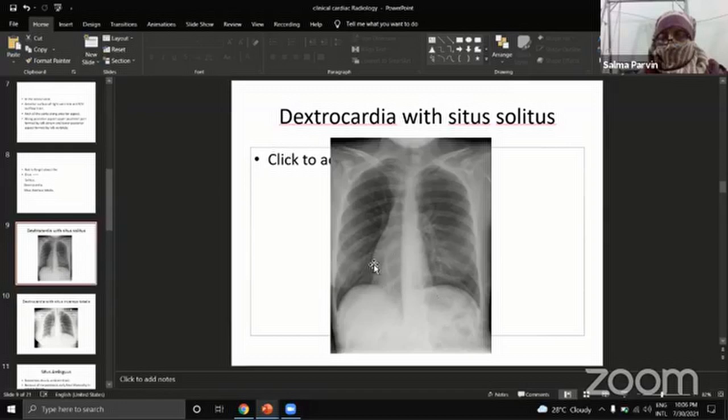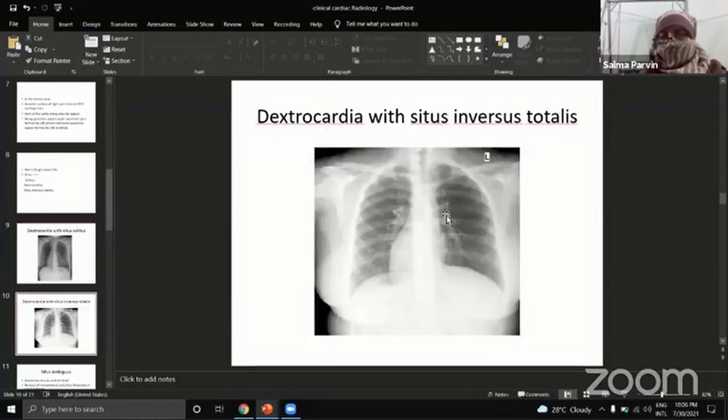So this distribution to the periphery is normal. Again, this film is normal also, carrying the similar pattern of pulmonary vasculature, where the vessels are tapering down, the denser vessels are at the bases, and the apices are clear.